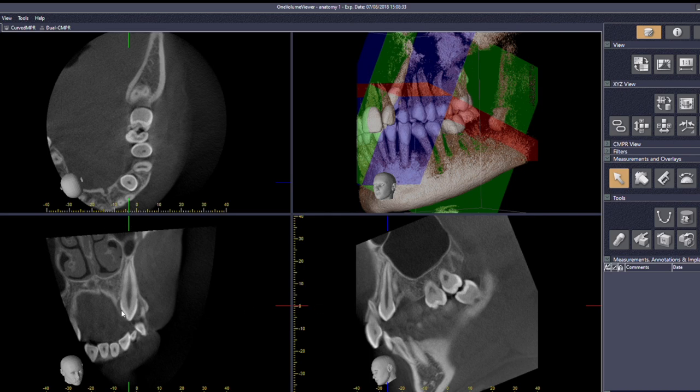We're going to line it up along the coloured lines and then take your coloured lines off to give yourself a nice view. When I said about dental tissues earlier, I spoke about enamel, dentin, pulp, PDL space and lamina dura. And if you look at this picture here, you can clearly see them all. There's enamel, there's dentin, there's pulp. And look along this side, you can see the lamina dura and PDL.